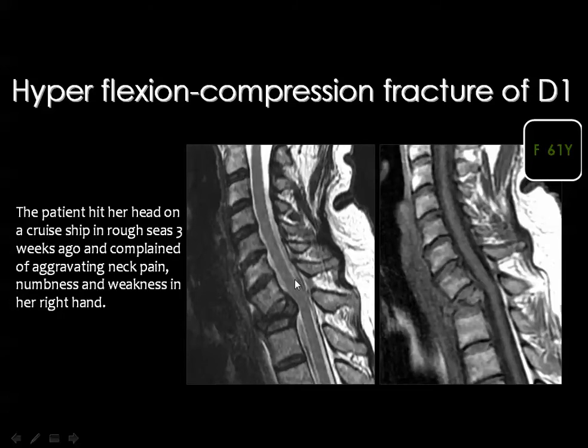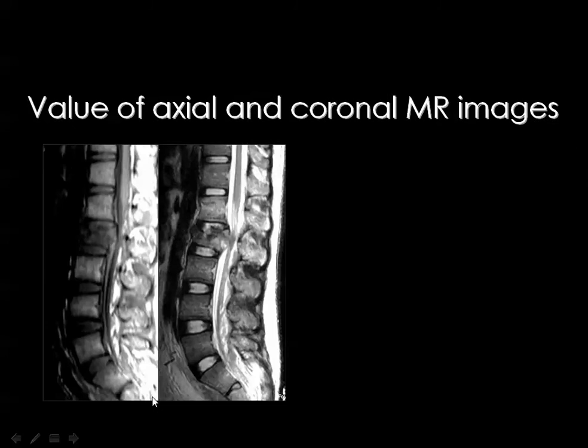You can see that the cord is a little bit compressed, but you can appreciate that the cord parenchyma is of normal signal intensity.